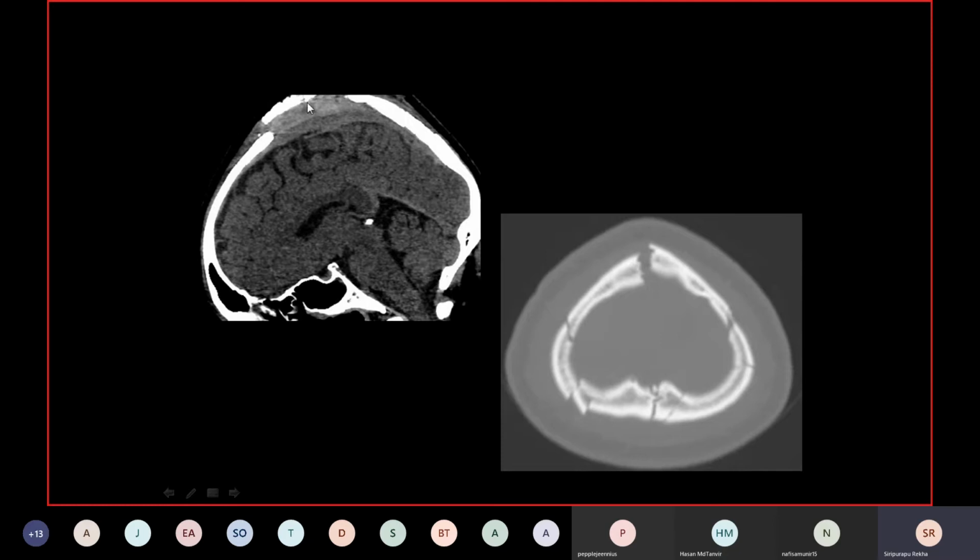If we look at this patient, he had a massive extradural hematoma. Fortunately or unfortunately, he's decraniectomized himself, because the cranium is lifted up, we're not seeing much mass effect, and that's why we're not seeing much on the axial images. But this is quite a devastating injury with a potential to injure the superior sagittal sinus here. So remember, it's always important to look at other planes, especially when there is a clinico-radiological apparent discrepancy.